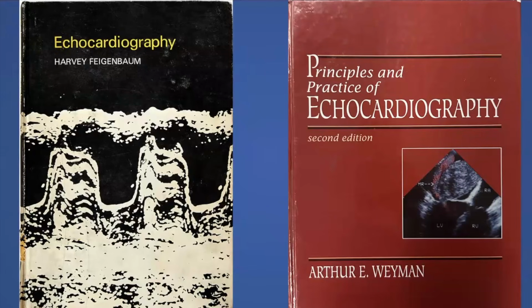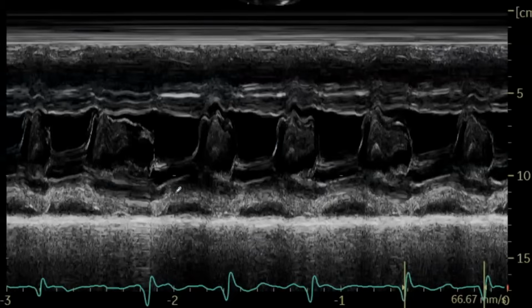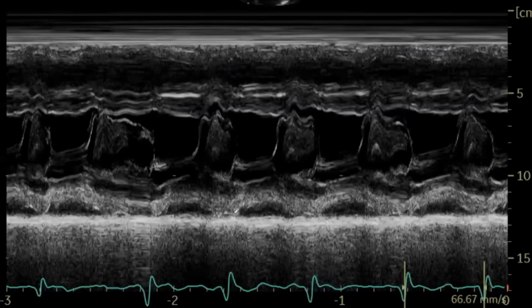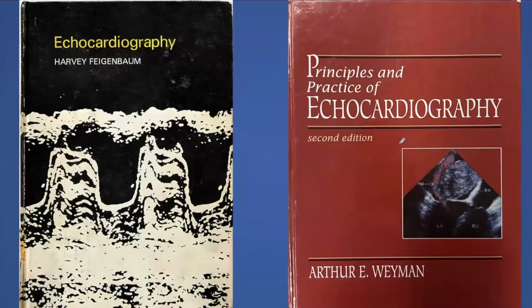So this is the same thing. If you remember the M-mode, it's supposed to be empty from inside, isn't it? How about this one? It is filled. There is something inside it. So Dr. Robert Howard told me that diagnosing left atrial myxoma was the biggest victory in echo when it started as M-mode. And he told me this is why the books put this one.